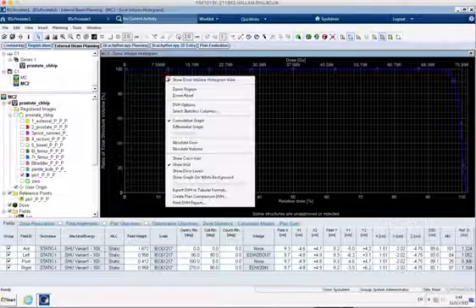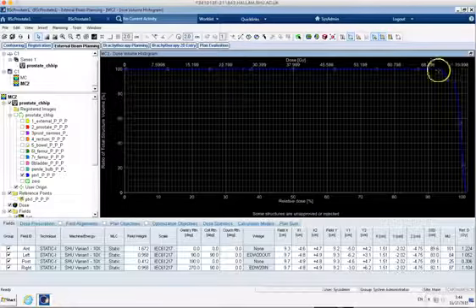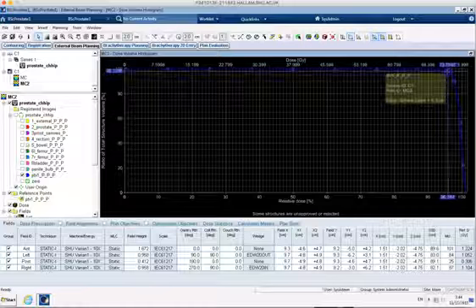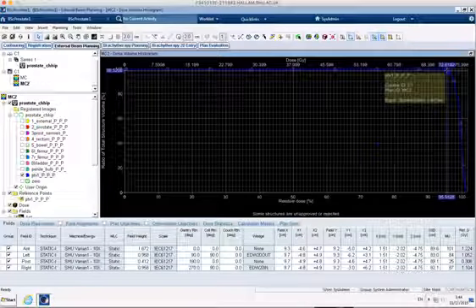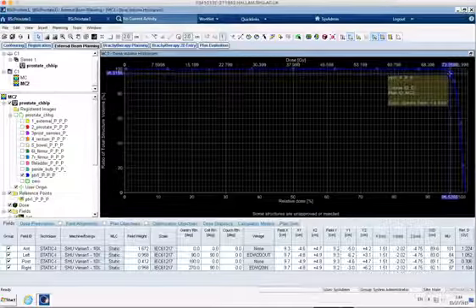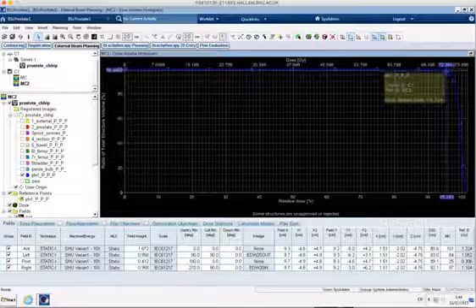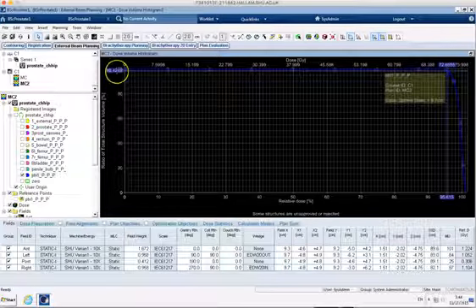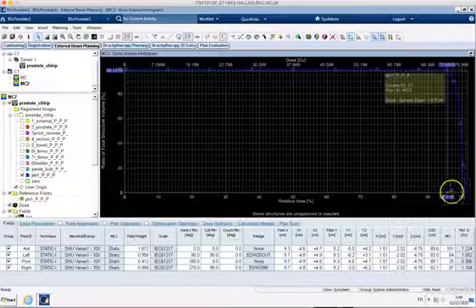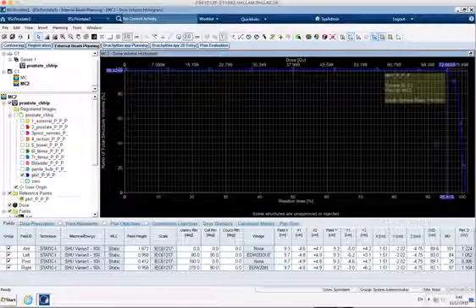So I'm going to right click on my crosshair, and D98 is up here, across here somewhere, and if I left click and hold the left mouse key down like this and just slide up and down until I get 98. About there. I'd spend a bit more time getting that right. And you can see we're literally just in tolerance there. If this was a clinical plan, I would personally spend a bit more time doing that.